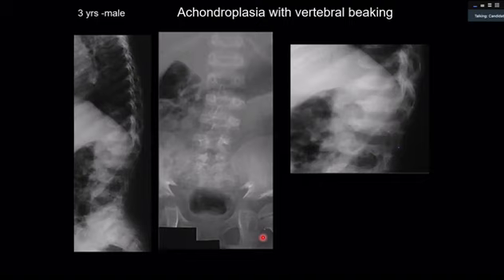They have the characteristic tombstone appearance of the iliac bones bilaterally. On the lateral projections, I can't really see full details within the whole spine image, so I just comment on the zoomed image. There is abnormal bullet-shaped vertebrae with decreased height and shortened pedicles as well.